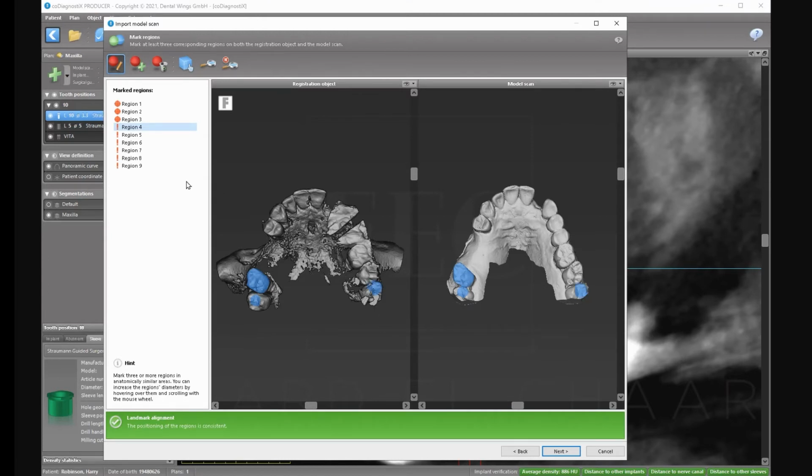All right, I see it lined up, but I don't care. I'm going to go back and place one more here, and I'm going to place... See those? I cannot see them. All of these. So I'm going to put one more here, one more here, one more here, and one more here.